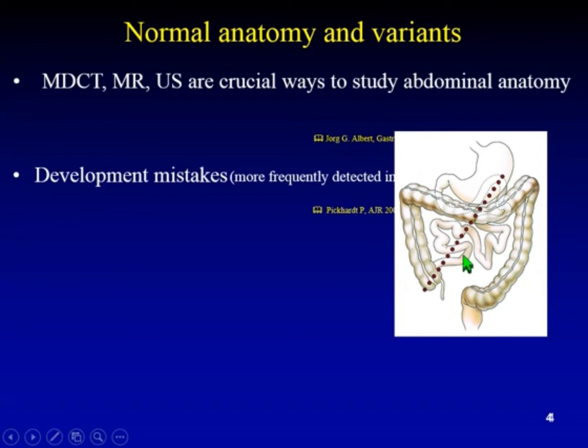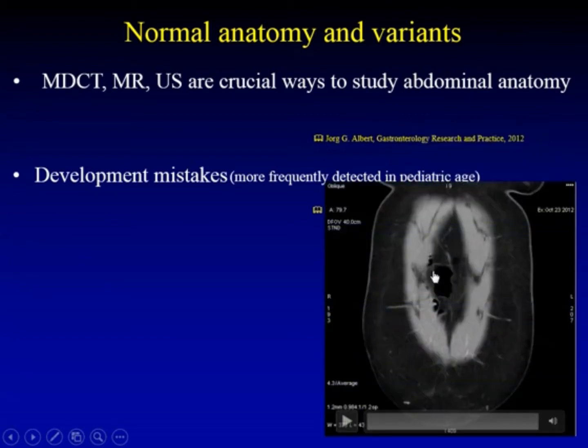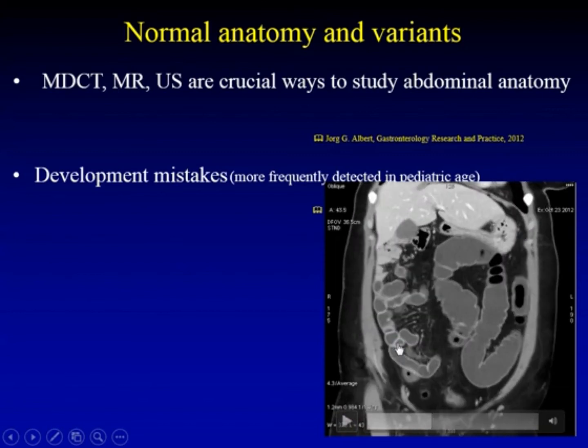result of the embryological development is the fixation of the peritoneum along this long posterior abdominal line that, in cases of a lesser line, gives more mobility to the structures of the GI tube. And this is a practical clinical example, a patient who arrived to us to perform a CT colon enema. Look at this strange situation.